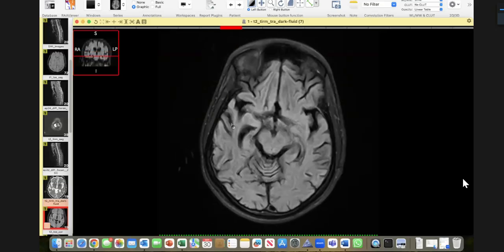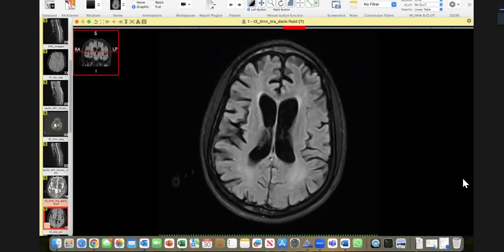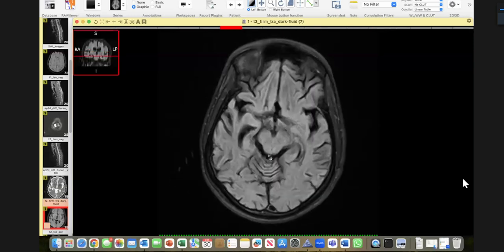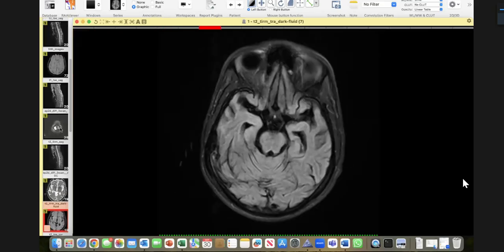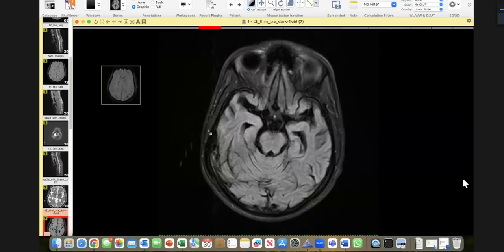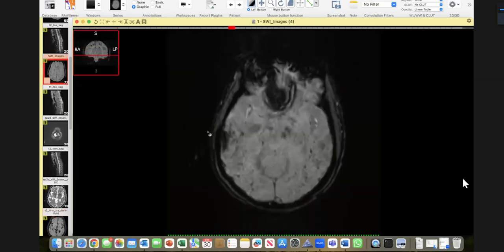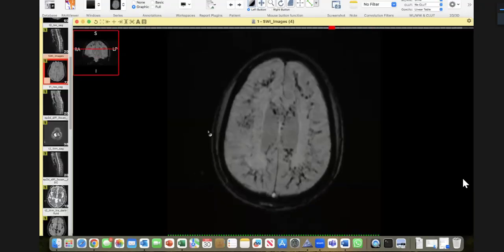And one thing is that there is diffuse white matter abnormality. Now here, you cannot expect to gain anything out of a T2 versus a FLAIR. You will never gain anything, T2 versus FLAIR with this kind of pathology. You have to keep thinking, I want to do DWI, I want to do this, I want to do this. Now, this is a case of fat embolism, and it's a classical case of fat embolism.